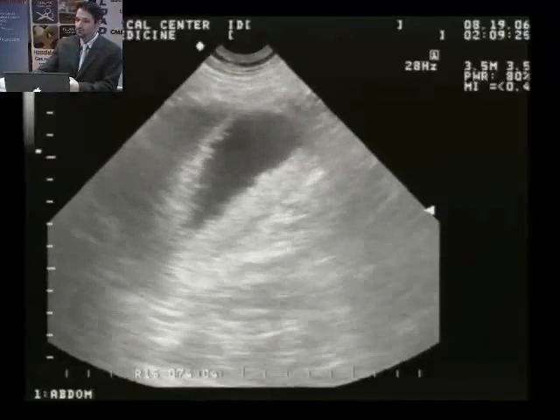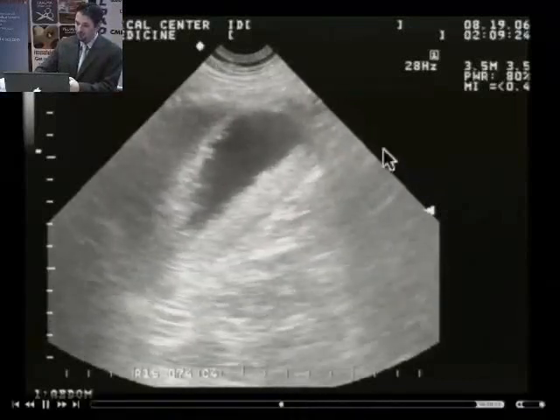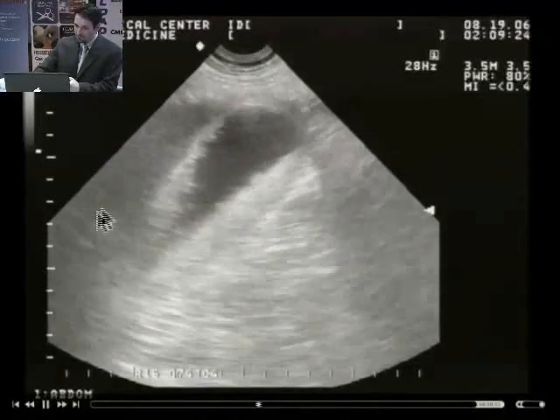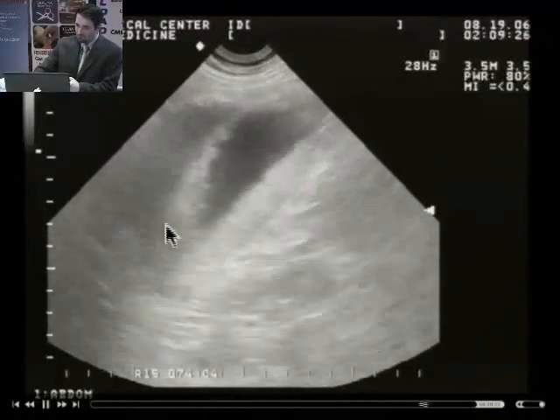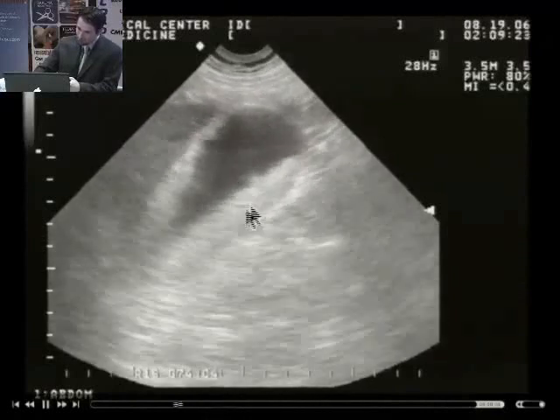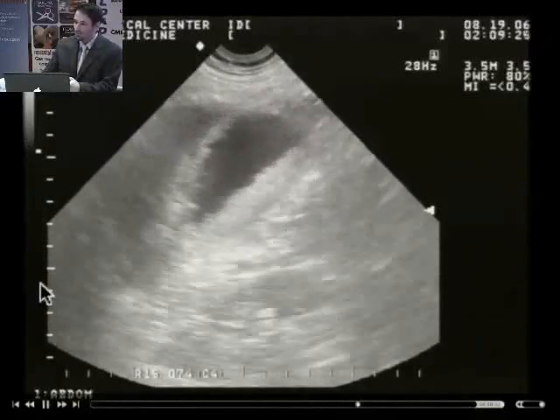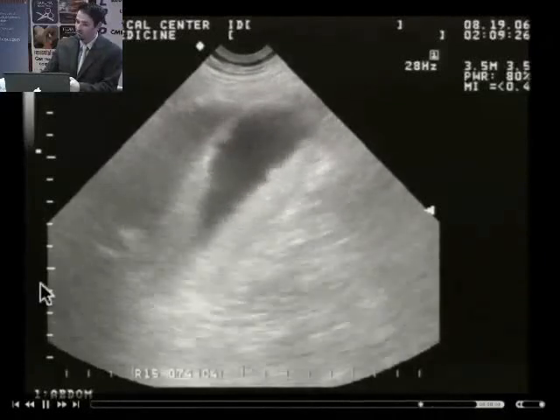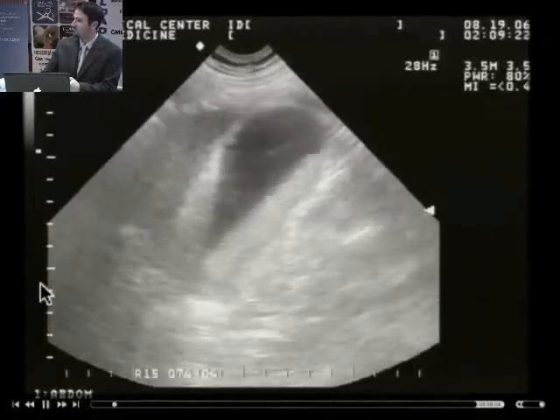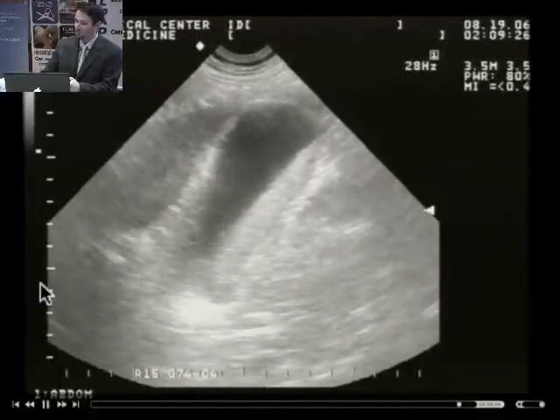All right, this is a different clip here. Kind of an interesting looking gallbladder here. So liver off to the side, gallbladder front and center. And then there's this thick white substance here. And you might be tempted to call that stone. But notice that there's no shadow beyond it. The gain is a little bit high in this image. The volume is a little bit turned up too high. But still, there's not a shadow in sight beyond it.